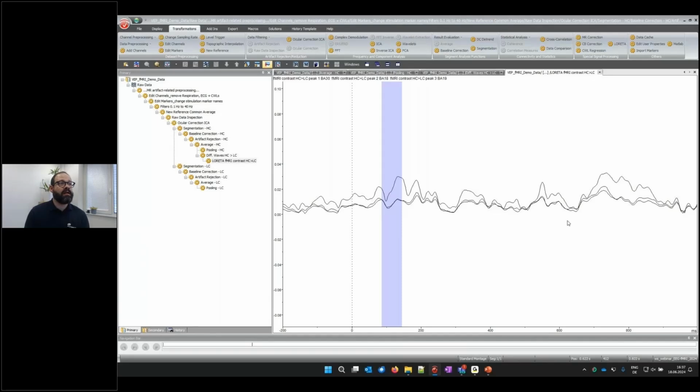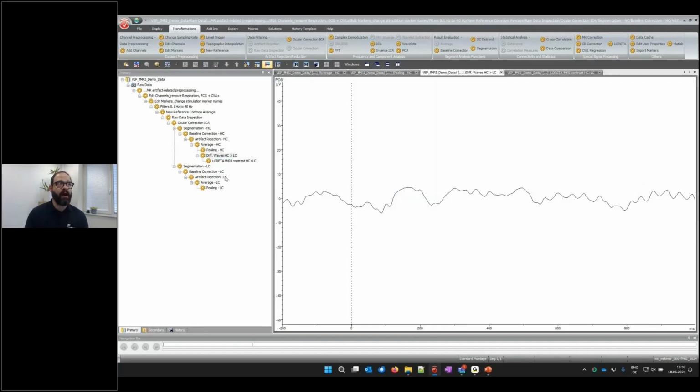Okay, so let's now do it the other way around and see if we can actually get some similar information from our non-fMRI informed analysis. So to do this, I would actually go one step back and now simply use the transient LORETA to see what I can infer from the source activation map of the LORETA in the EEG. For this, it's actually not mattering if I use PO8 or a different electrode. I don't have to focus on an electrode, but it's just easier if it's bigger.